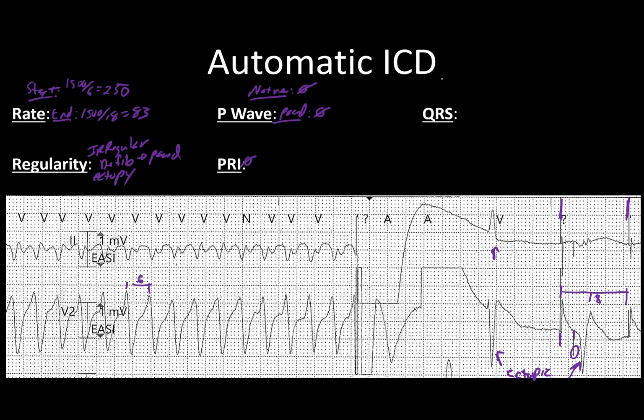At the very start, the native has an RS pattern and it's wide and fast. Sorry, I apologize, it has a small R, big S pattern.